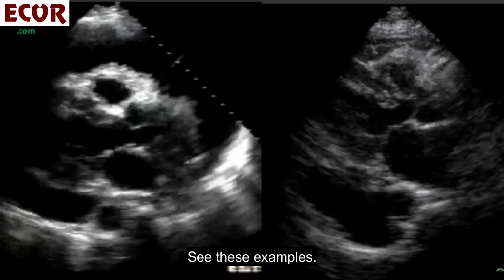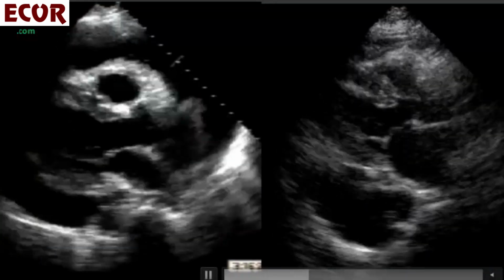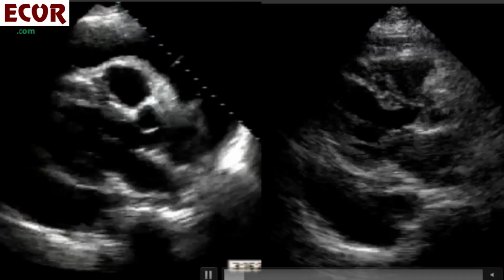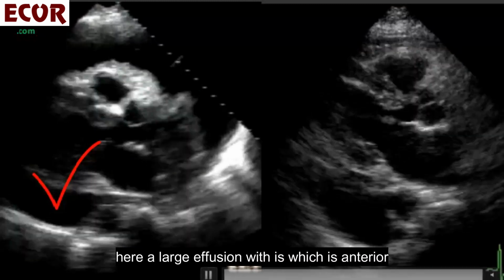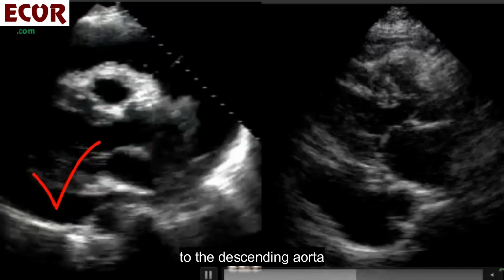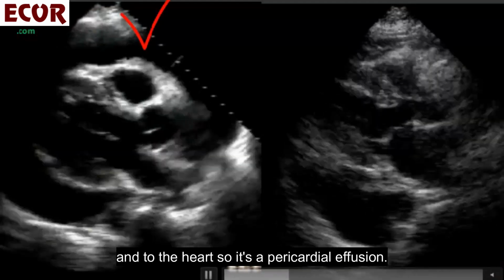See these examples. Here, a large effusion which is anterior to the descending aorta and to the heart, so it's a pericardial effusion.